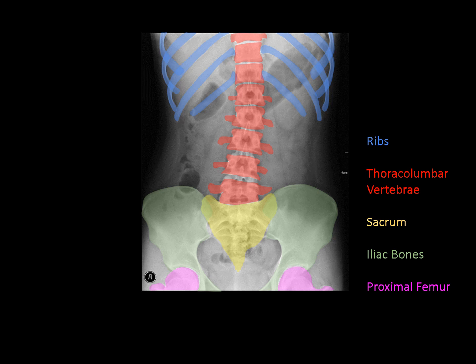And when you're looking at all these bones on an abdominal radiograph, again, it's not a dedicated study to assess the bones, but really you want to look for any abnormal contours that could indicate a fracture, specifically of the cortex on the outer aspect of the bone, and any suspicious lesion, whether it's a sclerotic, too bright, area or a lytic, too dark, area within a bone that catches your attention. Those are some of the main things that you'll be screening for when you look at the bones.